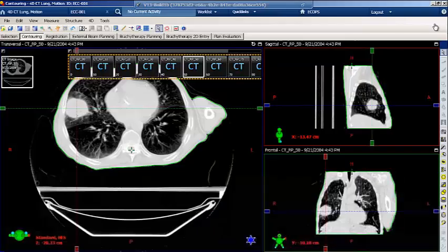There are a number of methods available to create 4D plans, and these may vary depending on the individual clinic's process. In this training module, the gross tumor volume will be outlined on all phases first to determine the amount of tumor motion using the volume statistics tool.